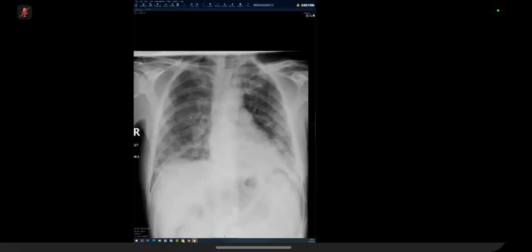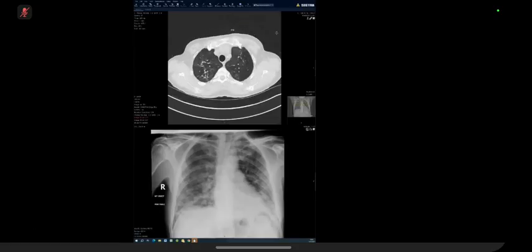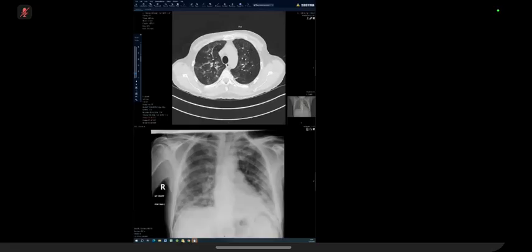This is more, like you said, it almost looks like pneumonia on both sides. And I think it is a pneumonia of sorts, but what kind? Pneumonia means airspace filling up with something, so it doesn't automatically mean infection. This can be a type of interstitial pneumonia, not infective pneumonia.